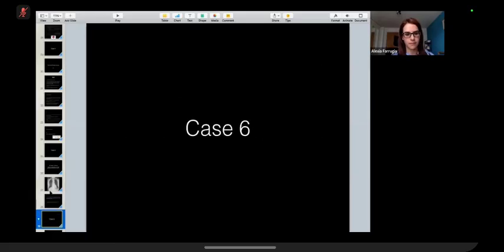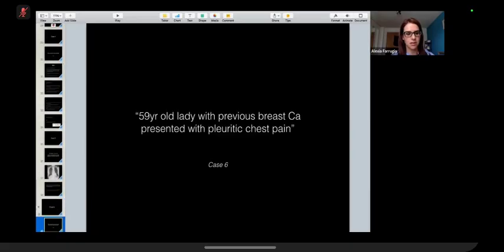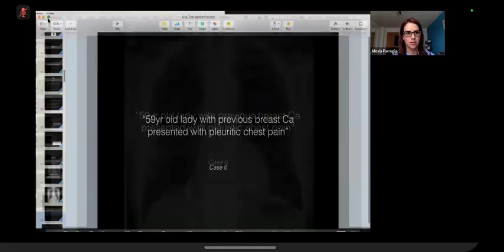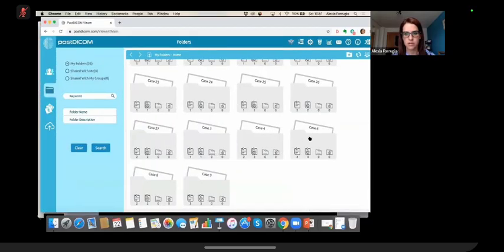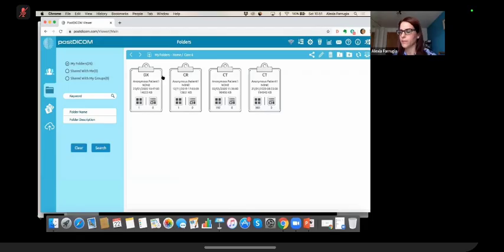Okay. So the next case. I'll just bring up my DICOMs for this patient. Okay.